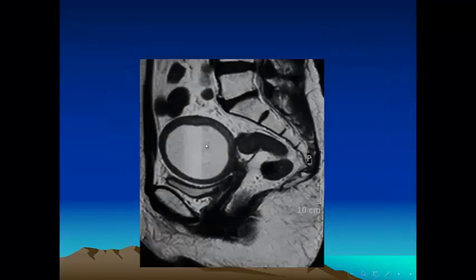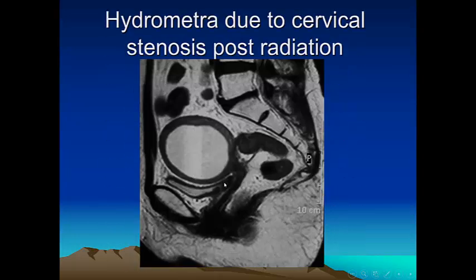Okay, and note here there's a fluid level. This fluid level denotes that it is just fluid inside the cavity of the uterus, and this is a common complication after cervical stenosis post radiotherapy.